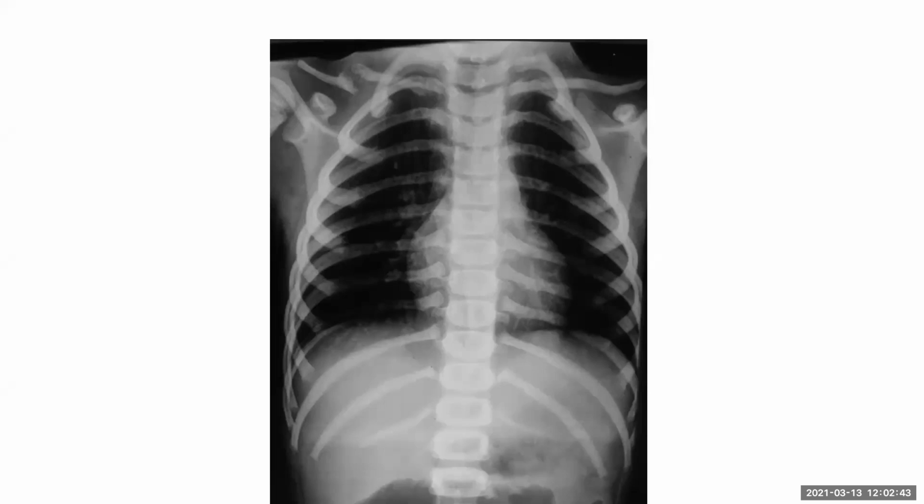Like you said, there may be another cause in bones. Yes, when I look again, the bones look a bit dense. So the density appears to be increased. So I'm thinking if this patient has a disorder of phosphate metabolism or fluorosis, I would be thinking regarding having a metabolic profile for this patient if possible. Okay, so we go to the next case.